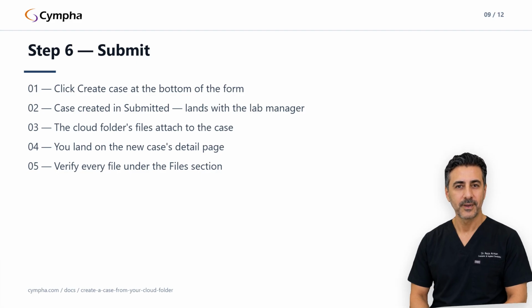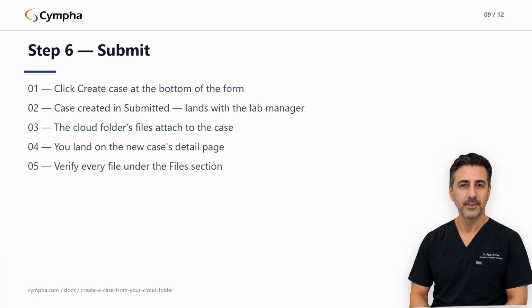Back in your cloud, check the source folder after submission. Every other folder is untouched. And the new case shows up in 2 places: the recent cases section under My Cases on the cloud page, and the full cases list.